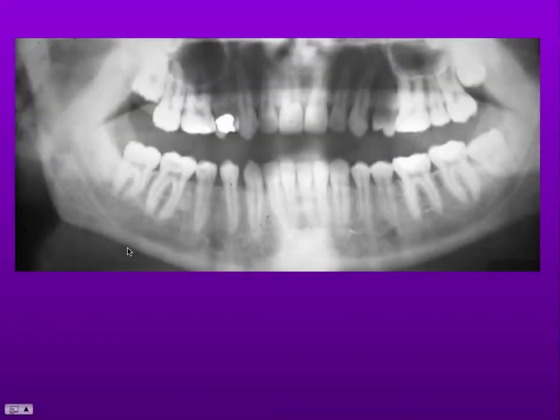Okay, let's count the teeth in this patient. We've got an 8, a 7, a 6. This looks very odd, but it's actually a patient who's had the 5 extracted and the 4 has rotated. It's also heavily restored. It's rotated so it looks more radiolucent because we're actually looking at this root mesiodistally, and therefore it's not so thick as a normal tooth would be in that plane.